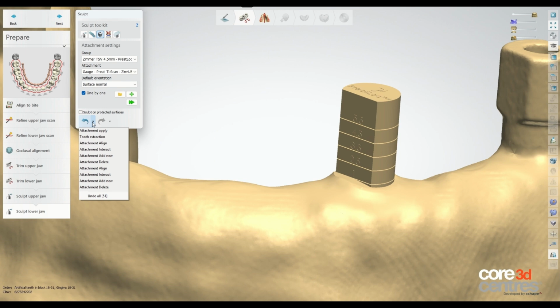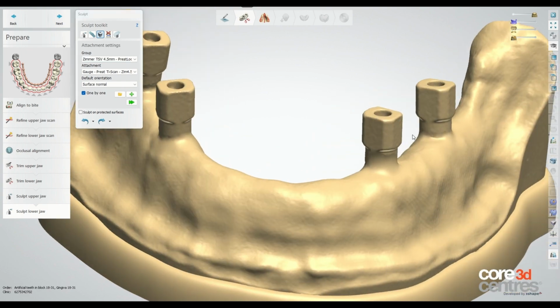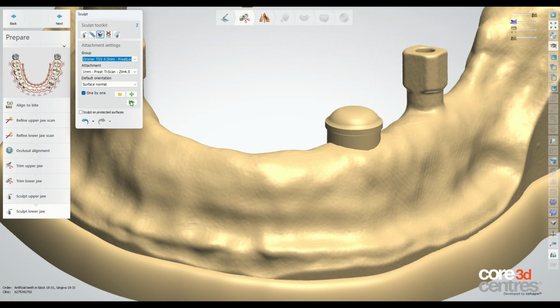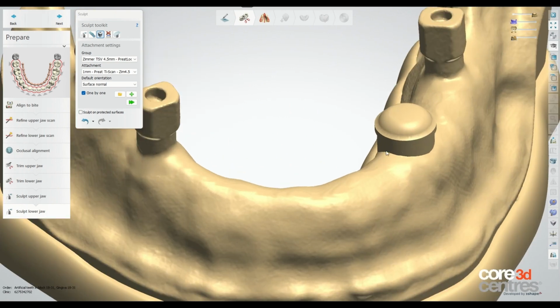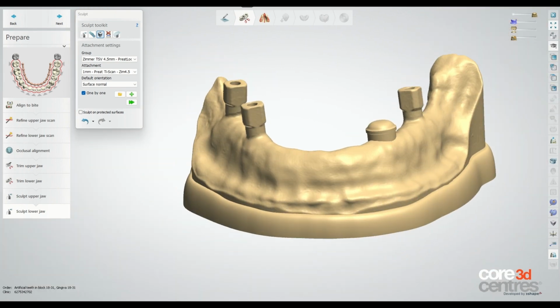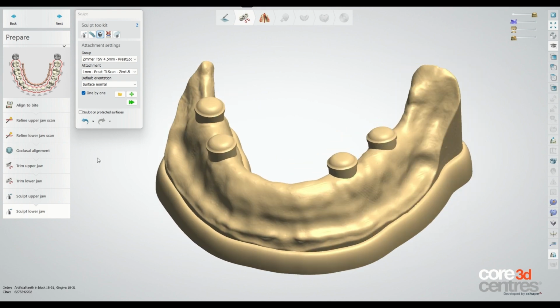Once the cuff height is determined, click the Undo button and revert to the Attachment Add New step and change the option from a gauge type to a cuff height that matches the measurement taken, and repeat the same alignment and trimming steps, then click Apply. This will place a template of a PreatLoc abutment with its housing on the arch, replacing the scan body. Verify everything looks good and repeat the same steps with the rest of the scan bodies until all of them have been substituted with abutment and housing templates.